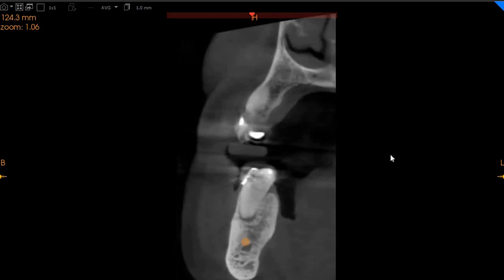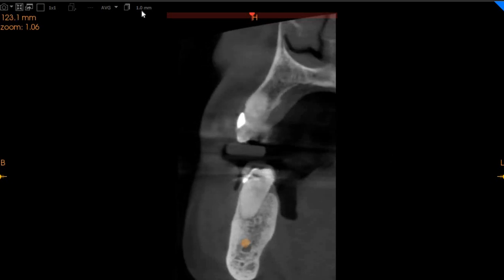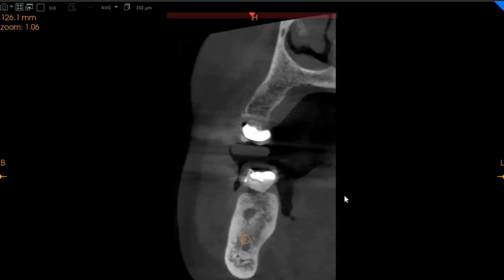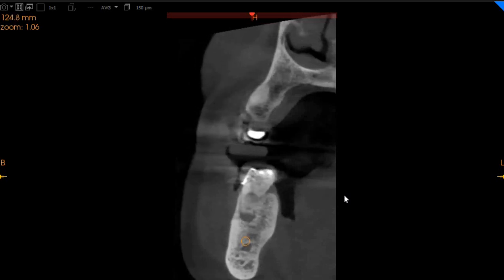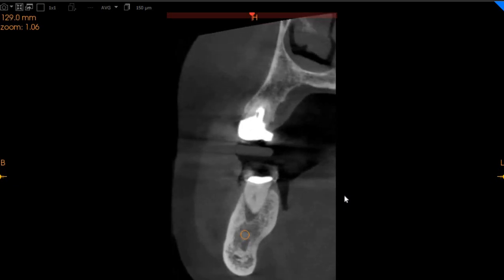Moving to the lower left first molar, we can see a major radiolucency. Along with that, we can see that this radiolucency is associated with some form of cracked tooth syndrome, as this patient has had similar complaints according to the doctor. We can also see that the radiolucency extends in the interradicular region, and as we move towards the distal root, we can see a radiolucency which resembles a J-shaped radiolucency in the lower left first molar. And here you can very clearly visualize the crack that is right here. And this is one cause of concern.